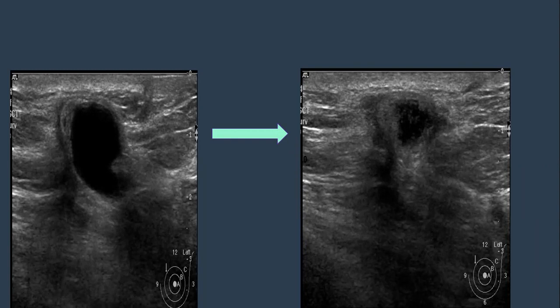And why is there more spiculation? And even look here, look at the adjacent area on ultrasound. This is the seroma. It's getting small, but what about this area, hyperechoic and this hypoechoic? And on mammography, you have calcifications. How can you explain all these changes?